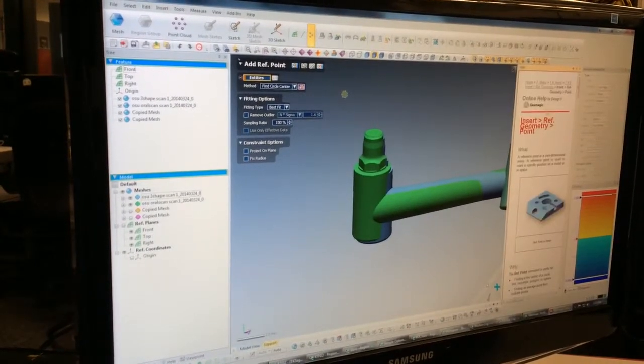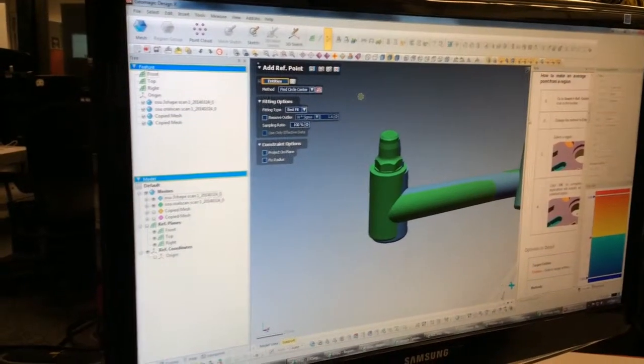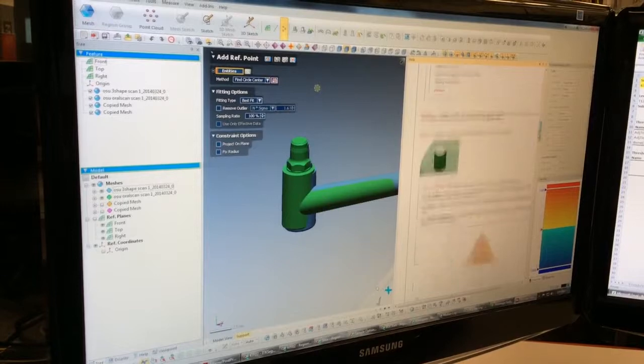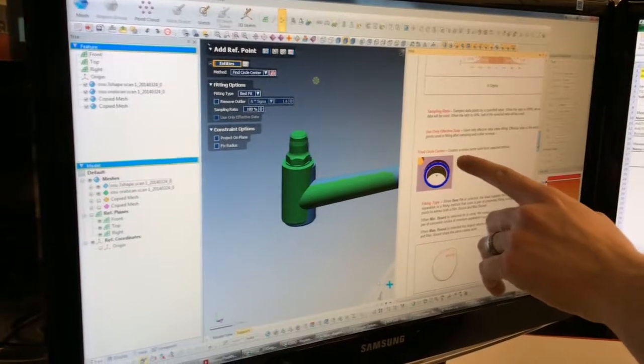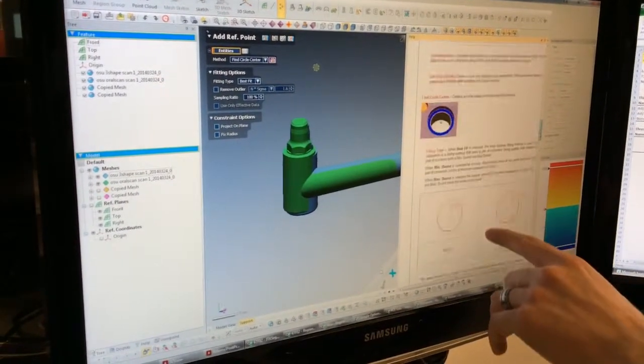On any one of these, if you click on it and hit F1, it'll open up a help on how to do what you're trying to do, and will tell you exactly what they are. For instance, circle center is self-explanatory, but still creates a center point from selected entities, and you can choose.